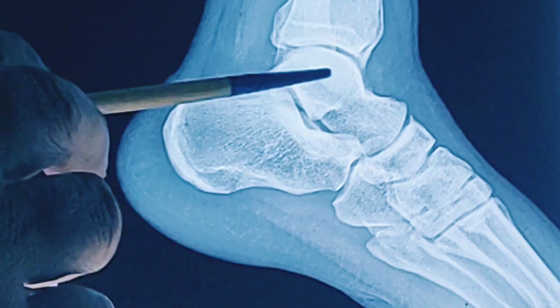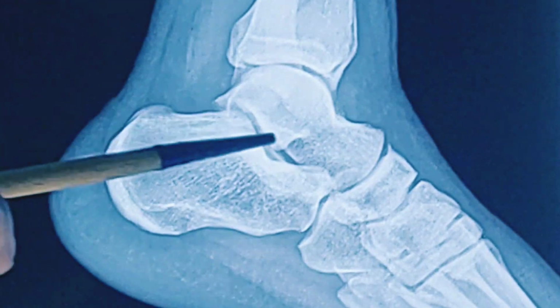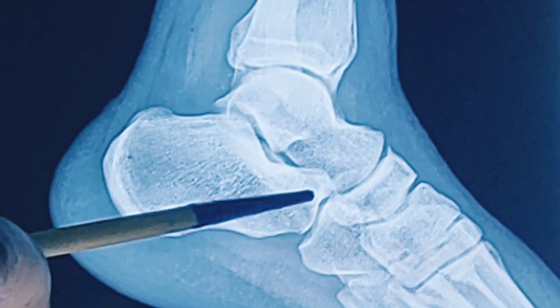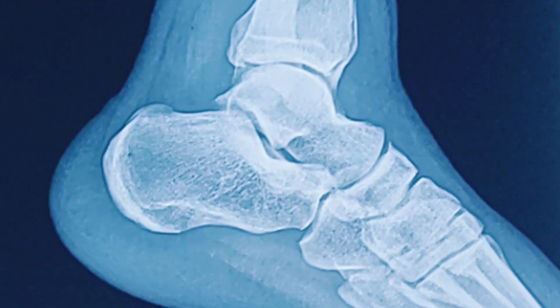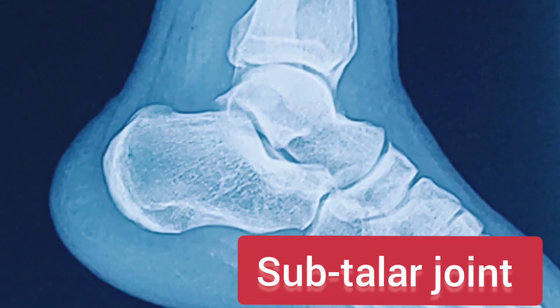This is the anterior part, this is the posterior part. So the anterior articulation here is a part of the talocalcaneonavicular joint, this one. But the posterior articulation is also called the talocalcaneal joint or subtalar joint.